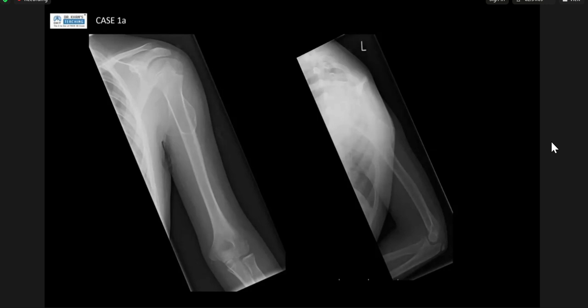If the patient has pain, I suggest there is a malignant change of the osteochondroma. I will review whether this patient has had an MRI, to see the cartilage cap thickness. If this is more than 1.5 centimeters, we will go with chondrosarcoma transformation of osteochondroma. I would also want to rule out soft tissue change, as this would indicate advancement from benign osteochondroma to chondrosarcoma.